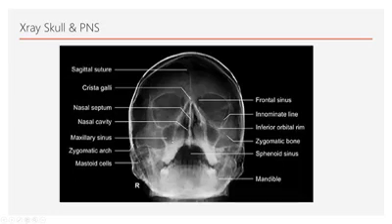Now a clinical question is about the maxillary sinus. When this maxillary sinus is a little bit hazy, this will indicate maxillary sinusitis. So the question may arise: what is the clinical change in this X-ray? If there is haziness or it looks more whitish over here, then you can say that maxillary sinusitis has occurred.